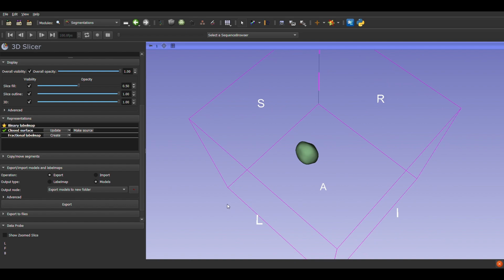That concludes our brain tumor segmentation tutorial in 3D Slicer. We have covered the entire process from loading the data, performing thresholding, using the threshold function, as well as manual thresholding using scissors, using smoothing to smooth the surface, visualizing the 3D model, and as well as saving the model as an STL file.